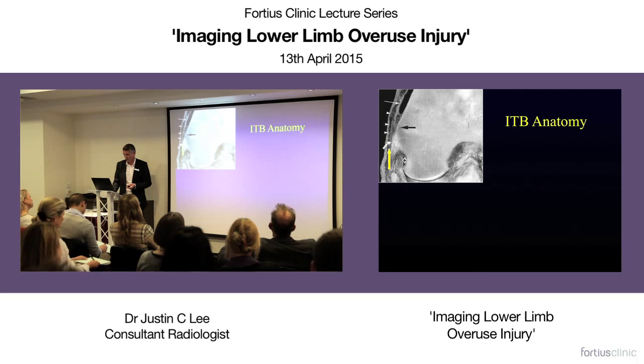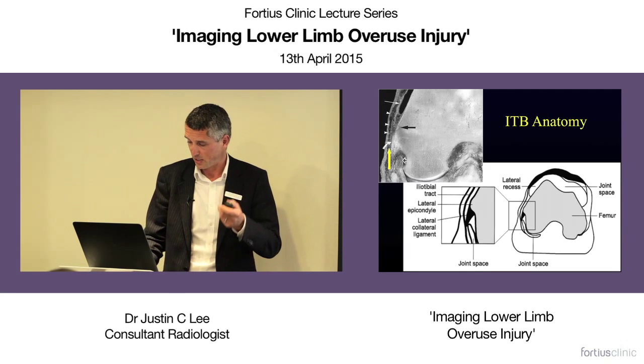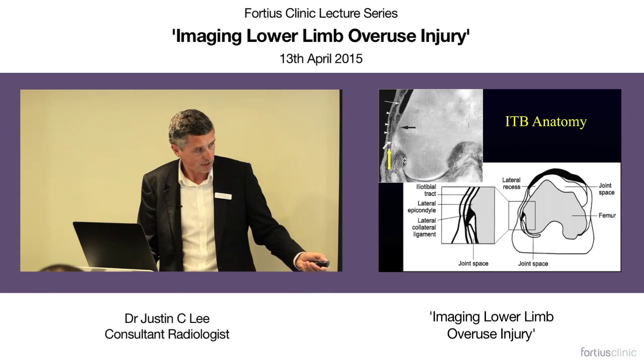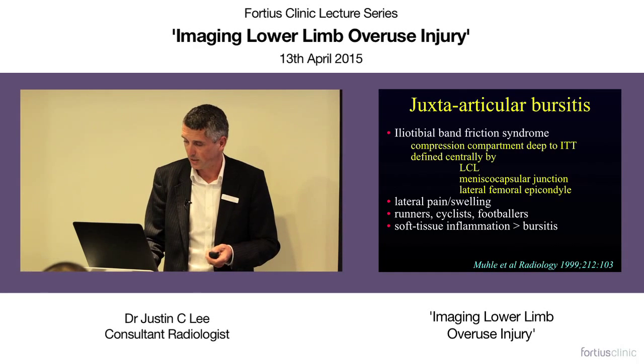So I'm going to talk a bit about now iliotibial band. Key thing really is about the anatomy. So you've got the skin, iliotibial band, and then lateral femoral condyle. It's often limited posteriorly when you see the inflammation by the lateral collateral ligament. And in terms of imaging, we have to be a little bit careful because this is the suprapatellar pouch. This patient's got an effusion, but sometimes that fluid goes all the way back there, and if you're not careful, you're calling iliotibial band in somebody who's actually just got a joint effusion.